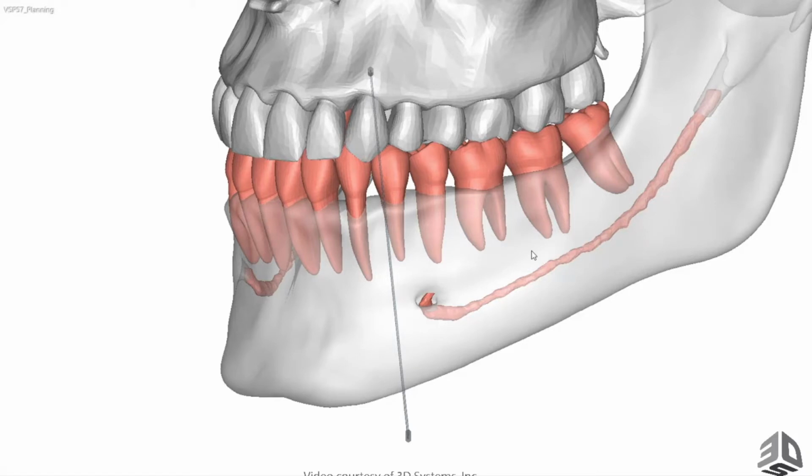When you're resecting, normally you will extract the tooth and then perform your resection cut. And from experience, I can tell you if it's too close to the remaining tooth, that tooth invariably will become mobile and you lose it. So you need to have a good amount of bone on the distal end of the last standing tooth so that you can preserve its integrity. So that's perfect. Yep. Okay.